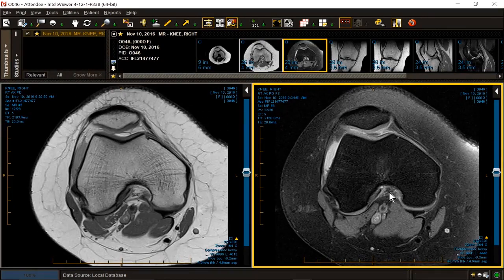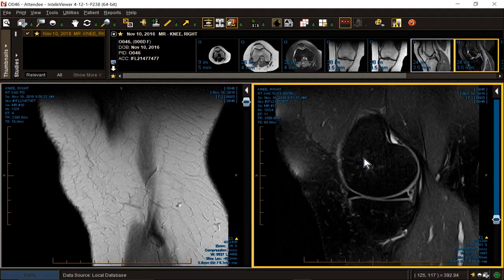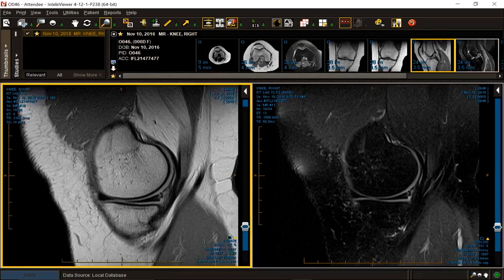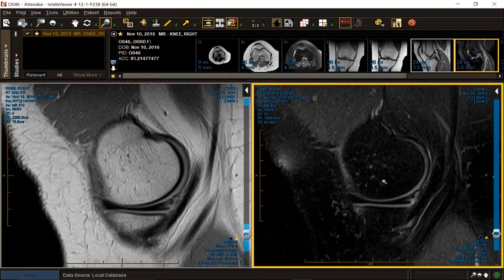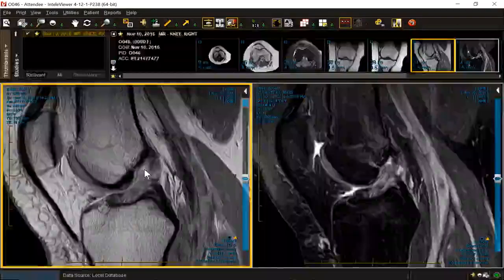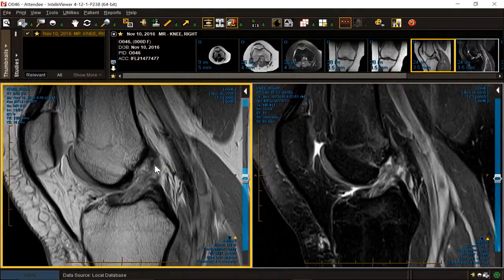So far, we got a lot of information from just the axial. We're already suspicious that we have an ACL transection. So since it's the ACL that has tipped my hat, I'm going to the sagittal because I'm going to be expedient, efficient, and fast. Let's do it. The sagittal, ideal for the mid-ACL, although it does a pretty good job for the proximal femoral end. I like the axial better for it.